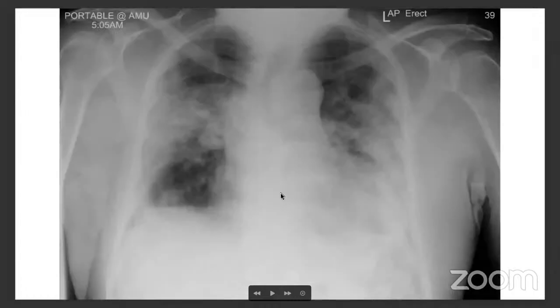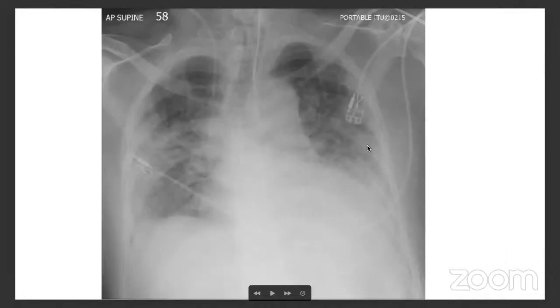This next X-ray, as you can see, shows more like lobar or segmental, subsegmental consolidations. Again, it's just like any other consolidation, any other pneumonia. You can't really differentiate that. This is how the pneumonias look on a chest X-ray. And as it goes down, those pneumonias have cleared, and you can start seeing more of interstitial thickening and more of coarse shadowing.